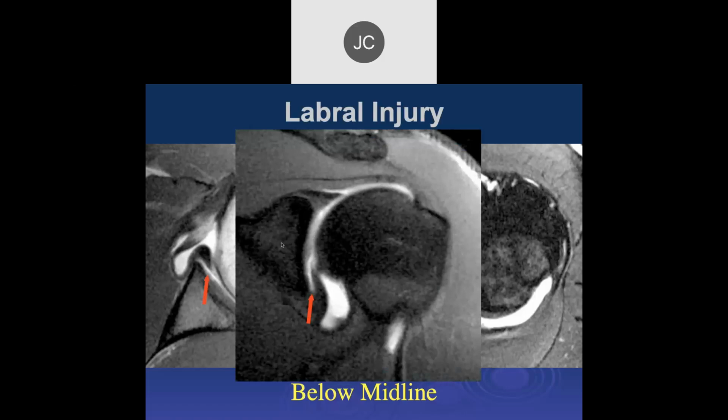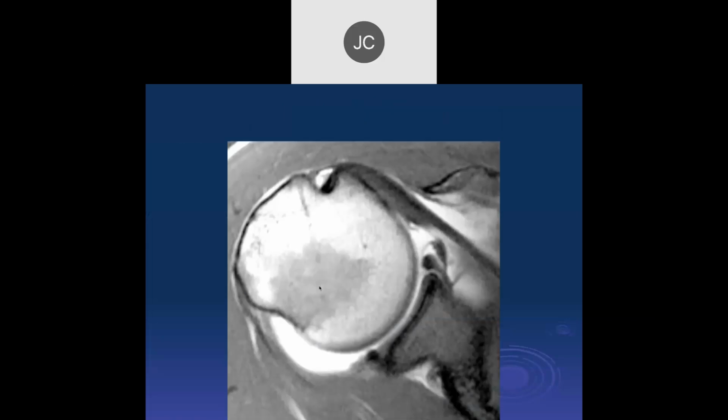This patient went to surgery. They had a strain of the middle glenohumeral ligament here, and they thought that the labrum was way too lax and probably was a tear, but it was an incomplete tear, and they actually didn't do any suture anchor repair. That's kind of an unusual labrum in that area, John.